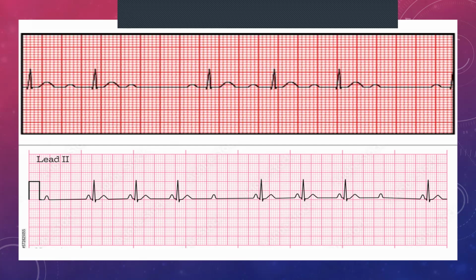And they're quite generous in that when they talk about Mobitz type 2, they normally give the example that I had drawn out, which is a wide PR interval with a wide QRS complex. And then they give you a Mobitz type 1 as a narrow. And the exam seems to prefer that as a question. So just something to remember. It's not to say it's necessarily like that, but if you see a wide QRS complex, chances are it's going to be Mobitz type 2, especially if there's a prolonged PR interval.